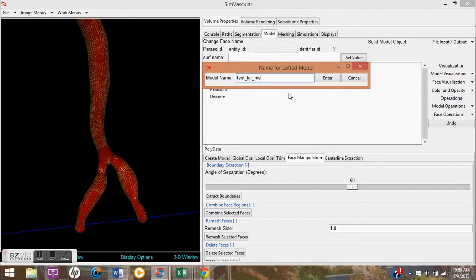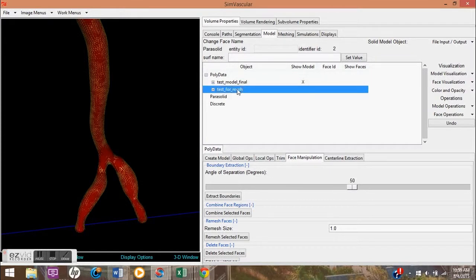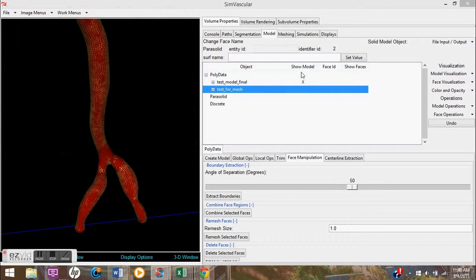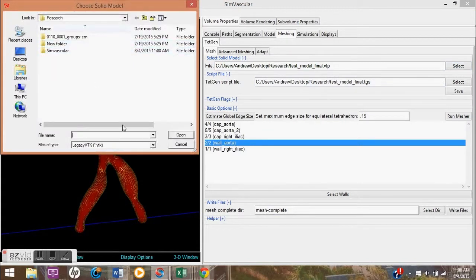I'm copying the model that we have now, creating a copy of it, using just the walls that I wanted. So I'm saving it because I don't want to compromise my model that I've been using for all of these tutorials. I want to keep that model, so I'm making a new one here so that I can manipulate and save.